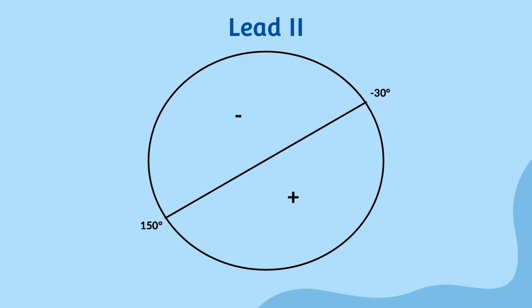Last, we'll look at lead 2 before covering a few scenarios and applying this knowledge. Lead 2 is considered positive between -30 degrees and +150 degrees. Therefore, a positive deflection in lead 2 tells us that the axis is within that range. Combining what we know about leads 1, AVF, and lead 2, we can determine the overall axis of any EKG. Let's examine a few scenarios to bring it all together.